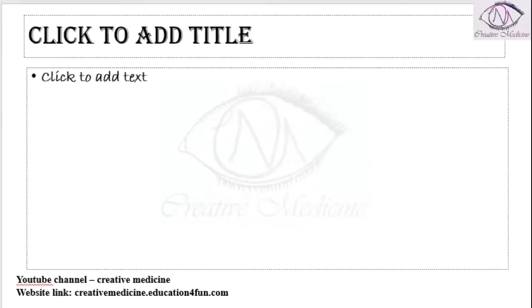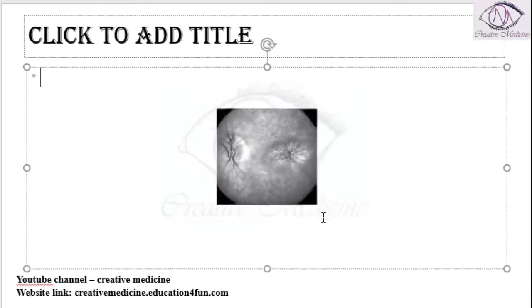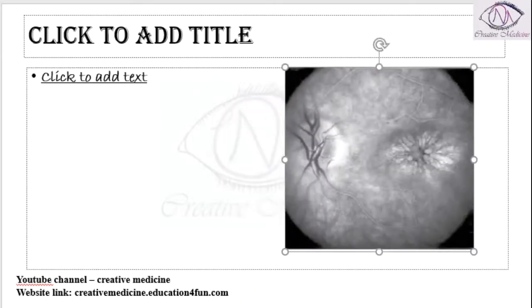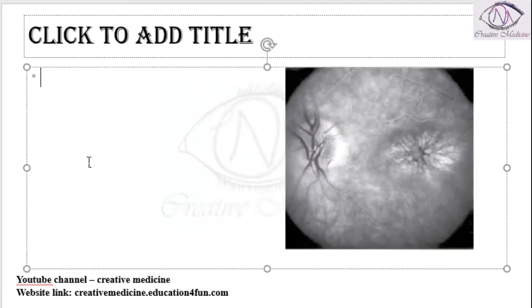If you do a fluorescein angiography, we can see the appearance of a flower petal pattern on fluorescein angiography. So this is the flower petal pattern which is seen in fluorescein angiography for cystoid macular edema.